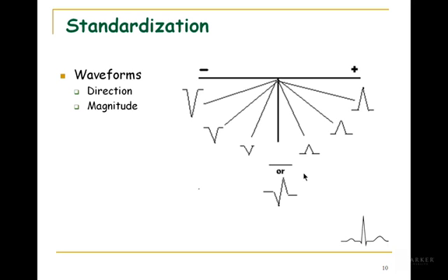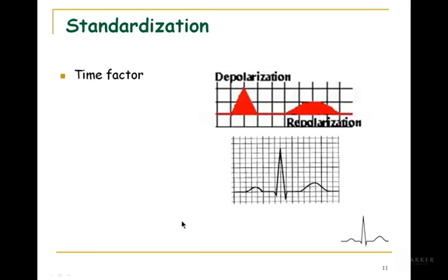So in lab, you had a positive recording electrode on your left ankle. You had a negative one on your right wrist. Most of you, if not all of you, should have seen a pretty good upwards deflection, say for the R wave, because normally that electrical activity is running very close to parallel to that particular view of the heart, and it's upwards deflected because it's running towards the positive recording electrode.